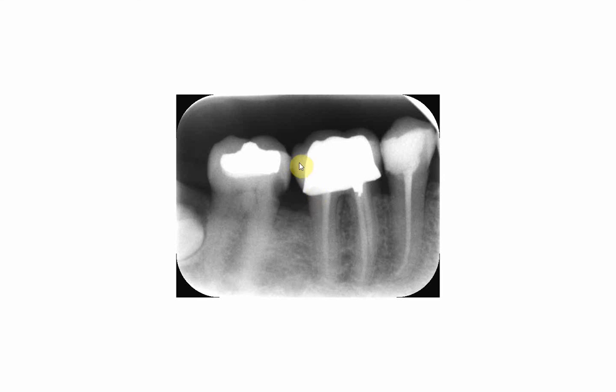Even the radio opacity of porcelain in this radiograph is less than the gutta-percha of the root canal filling.